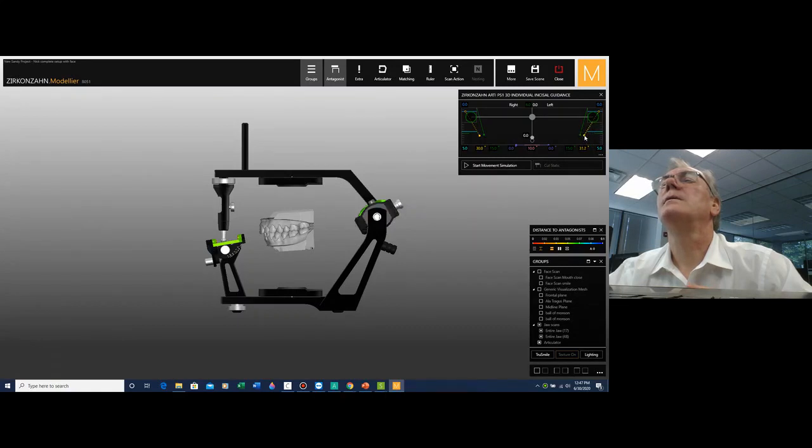Straight down, one. Okay, good. I'm going to have a little bit of a longer movement. So I'm bringing it to 7 millimeters, the extension of the movement. This varies according to how far you would like the movement to extend.